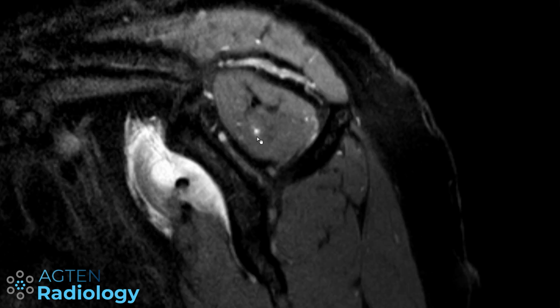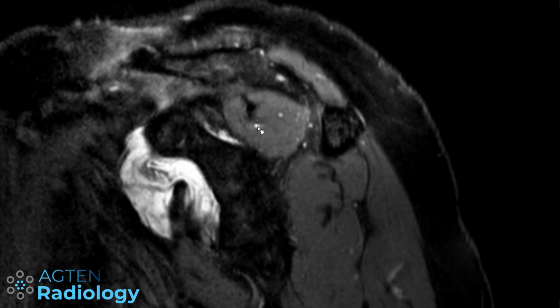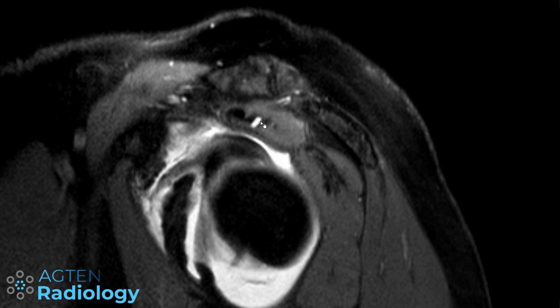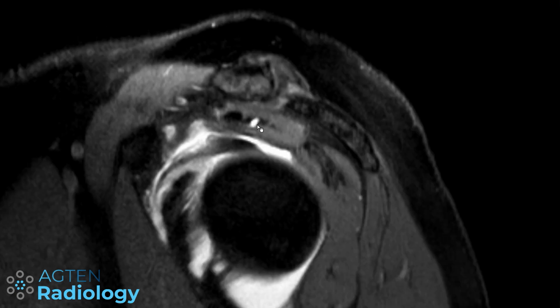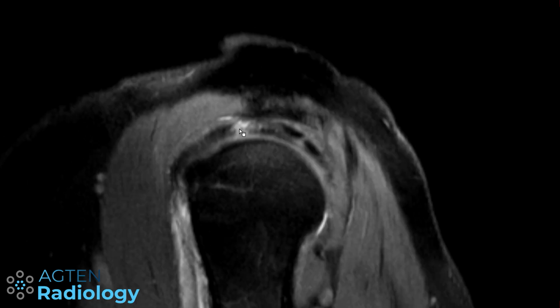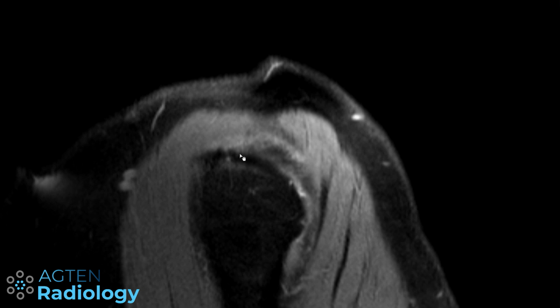And if you go laterally right now, we can see this tiny neck of this intramuscular cyst going laterally along the central tendon component here. This is the second component or the second cyst that we saw. And then it's going here into the tendon substance. Now here on this slice we kind of lose it, but then here we can see there is some signal changes in the tendon, and then here is a tear of the supraspinatus tendon at the posterior portion of the tendon, and the most lateral or superficial bursa-sided tendon fibers are intact here.